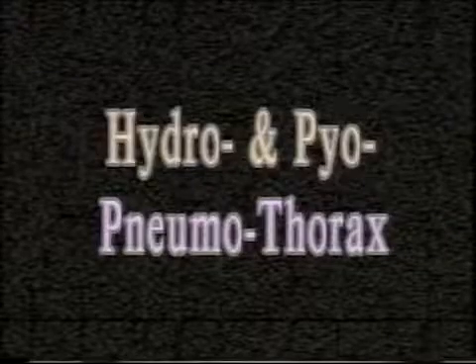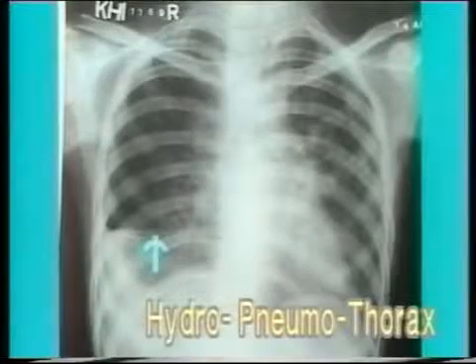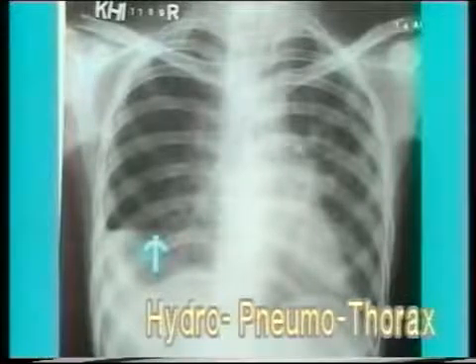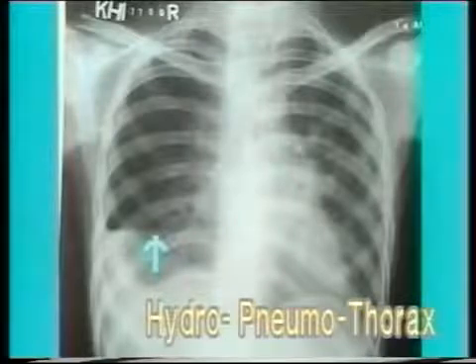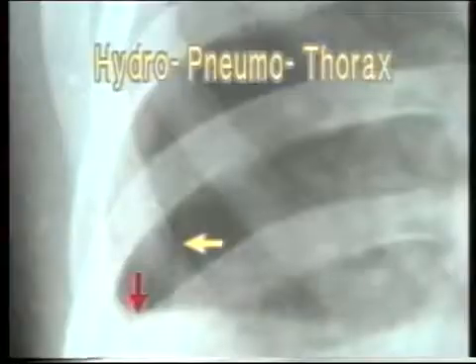Hydropneumothorax and pyopneumothorax. When the pleural cavity contains both fluid and air, the condition is termed hydropneumothorax if the fluid is clear and pyopneumothorax if the fluid is pus. This X-ray shows a horizontal fluid level in the right hemithorax which is touching the chest wall laterally.